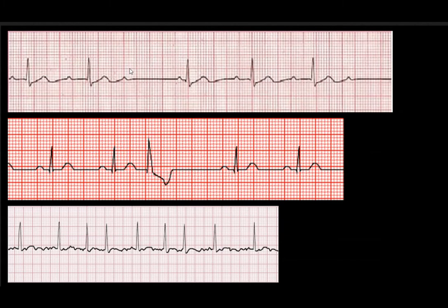Find out. So this is taking a look at that QRS complex, and we're going to answer a couple questions. That would be, are these regular or irregular? And do all the QRS complexes actually look alike? So let's dive in. Don't forget, we're going to need our calipers. So we're not going to worry too much right now about what we would look for our P waves.